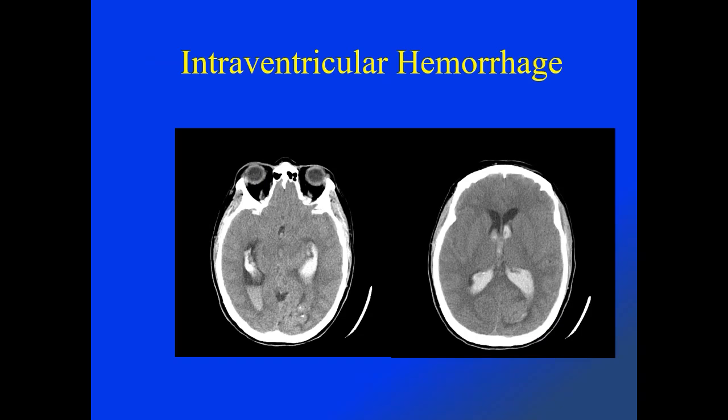Intraventricular hemorrhages, as I noted previously, usually represents a secondary phenomenon, although one could develop isolated primary intraventricular hemorrhages associated with intraventricular vascular pathologies or neoplasms. Typically, they represent a secondary hemorrhage with extension of hemorrhage from adjacent brain tissue.